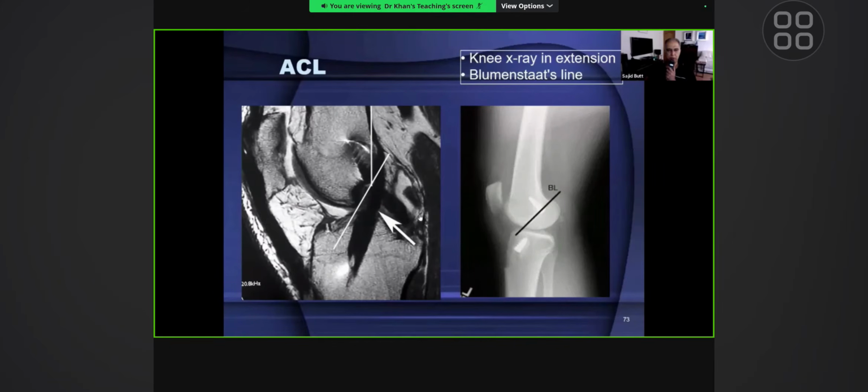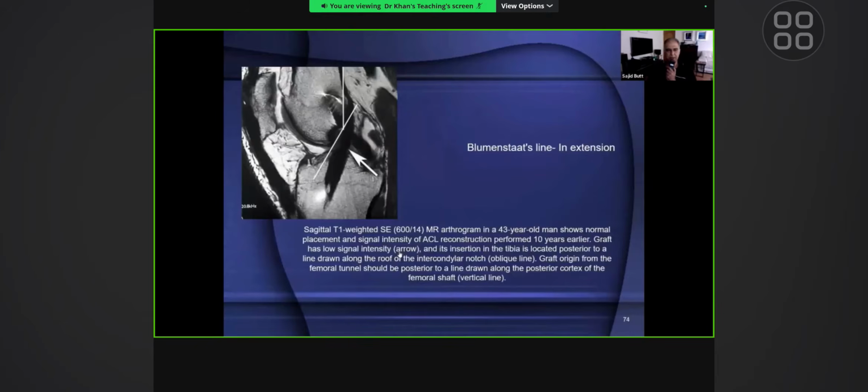It will carry on going back. So that's an incompetent ligament. It's a badly positioned tibial tunnel. It's very important to try and assess these when you're looking for effective repair of the anterior cruciate ligament. And you will come across these patients very commonly. It's a very common repair procedure done, and we as radiologists are asked to comment upon the adequacy of the repair.